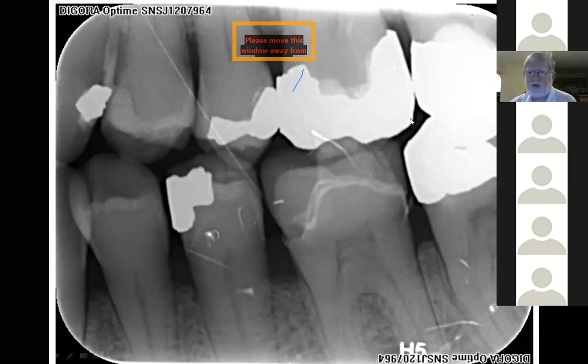3-6 mesial, fine. So we've got an Emax crown on here. There's a defect across there. So you need to go back and clinically examine the patient. Have you got a probe that's falling into there? If you've got a probe that's falling into there, ideally you need to replace that before things get worse.